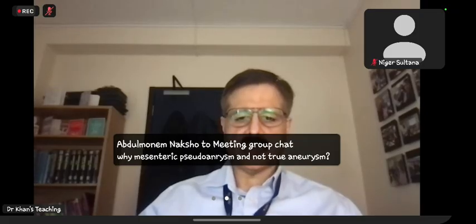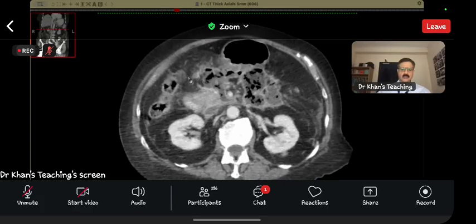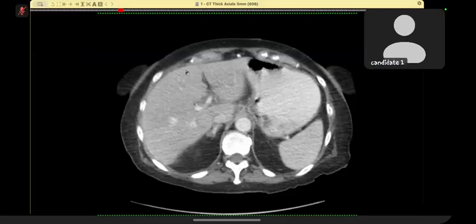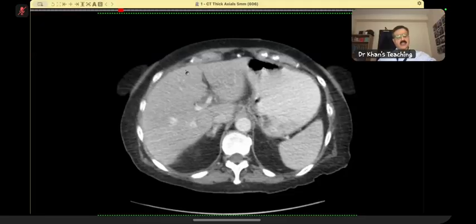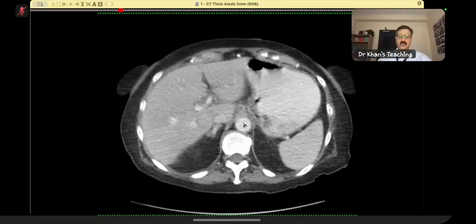Now let's go to the next scan. Try again to ask for the mouse, try to scroll through it, because otherwise the fun goes, isn't it? If I scroll for you. Okay, I'm asking now for remote control. So I have approved it. Try it.